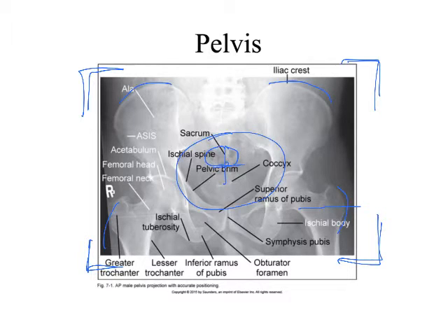Again, there's a couple of things that we'll look at to make sure the patient's positioned appropriately. So I've pretty much established that in terms of looking at this image the central ray and the collimation is appropriate, right? Is the patient positioned appropriately? What can we look at to determine whether or not this patient's positioned appropriately? The wings and the obturator foramen. Good. We can go right back to these, right? The obturator foramen, and see, are they opened?